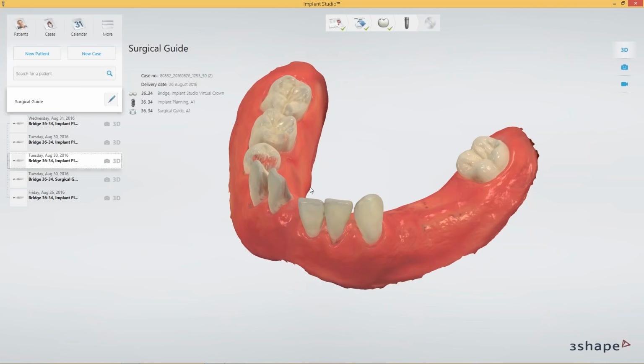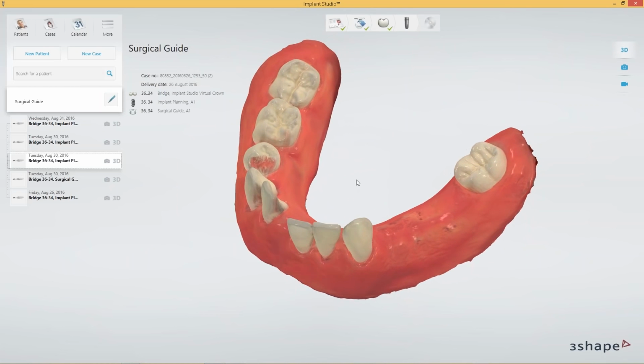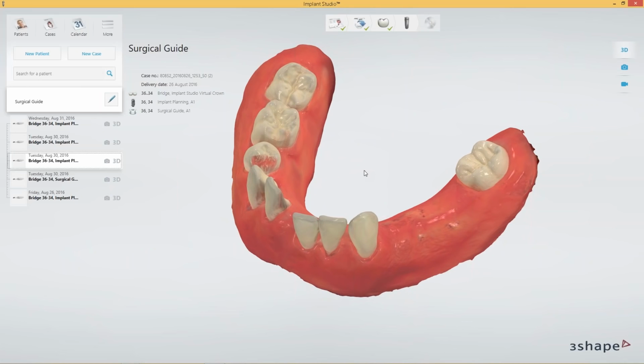Here we go. I mean, quite inspiring to see what is actually possible in terms of guide design. I assume some of the design ideas presented just a few seconds ago might be new to you. And as Jan pointed out, there's nothing right or wrong. It's just different ways to accomplish the same goal, to place the implants during surgery with a stable, good-fitting guide and still having the different options available.